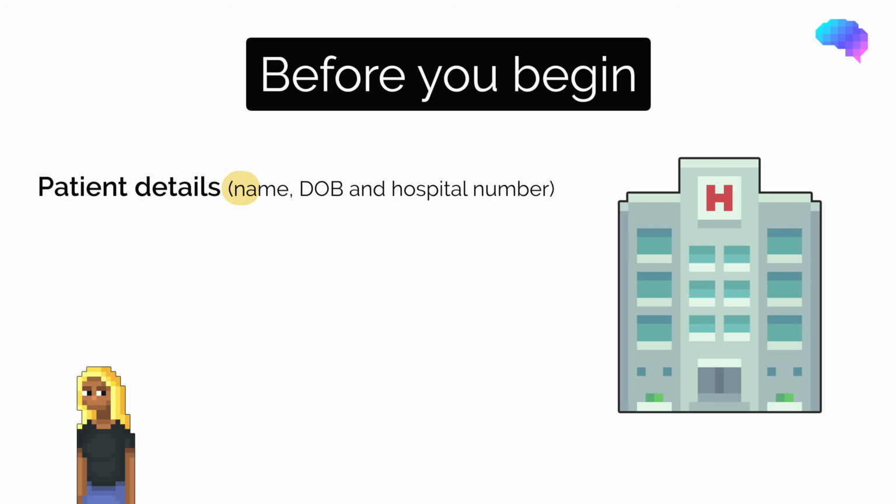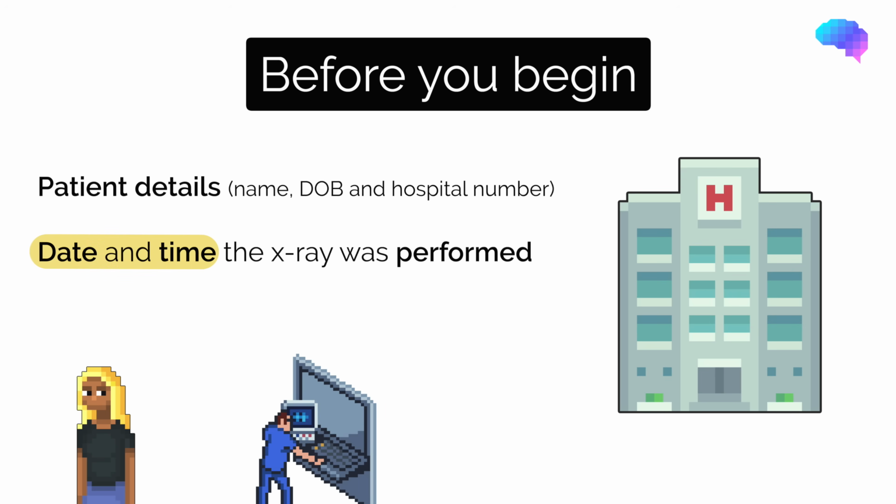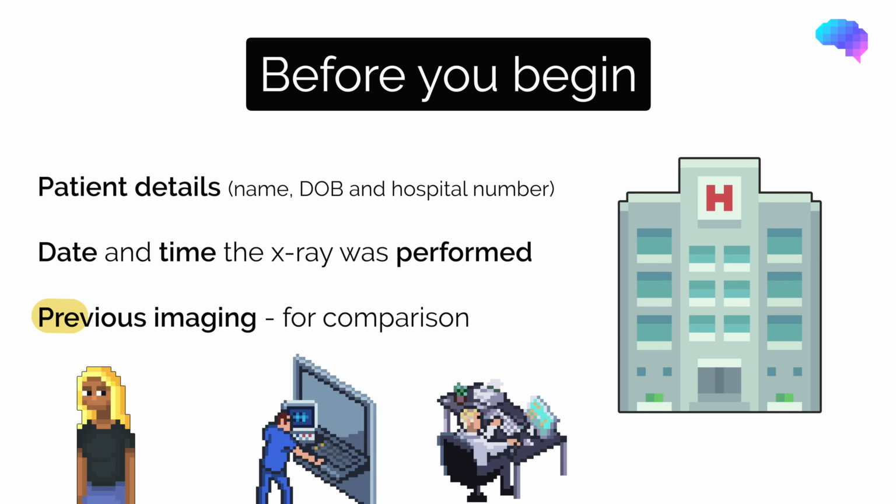Firstly, confirm the name, date of birth and hospital number of the patient and check this matches the details on the x-ray. Check the date and time the x-ray was performed. And finally, check for any previous imaging, as this is useful for comparison.